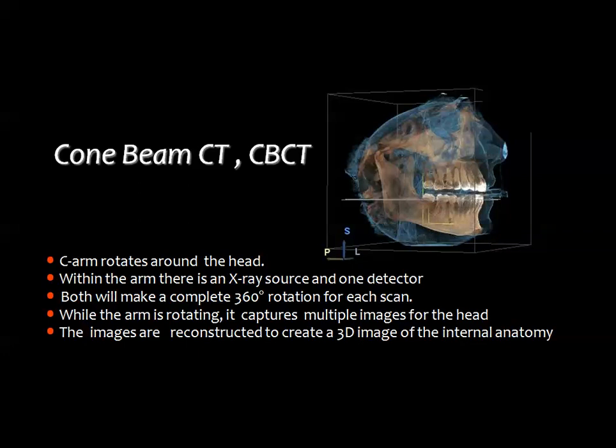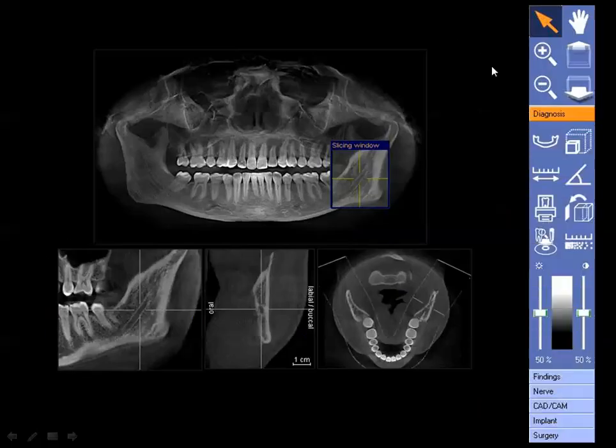And this is a 3D cone beam CT of the mandible, and you want to look carefully at the area of the mandibular canal, for example. Then you select this area in particular, then the scan will give you more detailed images in the axial, in the coronal, in the sagittal planes, whatever you like, the plane of imaging, and you can have such images.